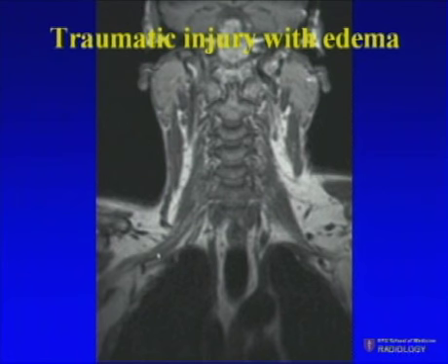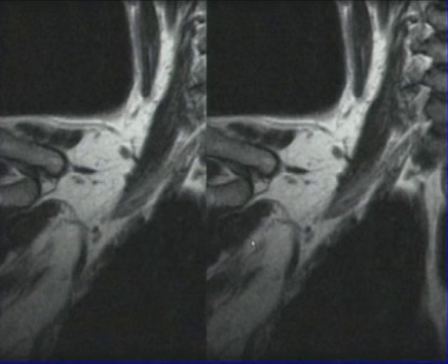It's kind of hard to see, but the fibers are somewhat indistinct. If we look much closer, you can see that we can't really make out the course of the brachial plexus as it's exiting through the scalene triangle into the supra- and infraclavicular fossa. The nerves look very indistinct, with no good look at the cords and divisions.